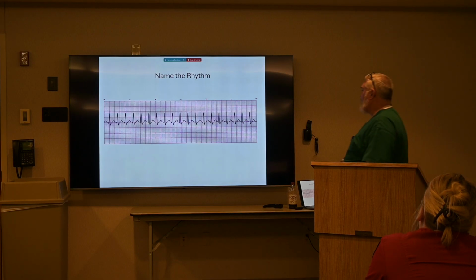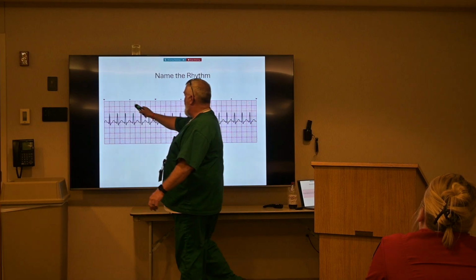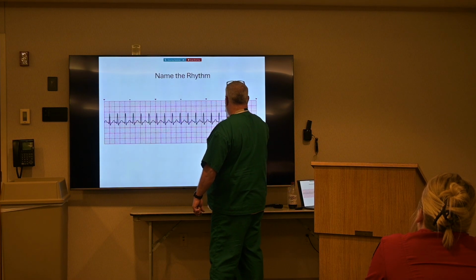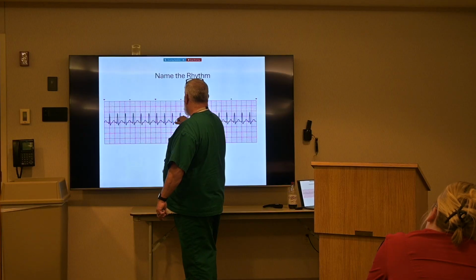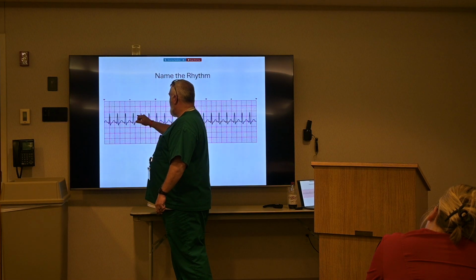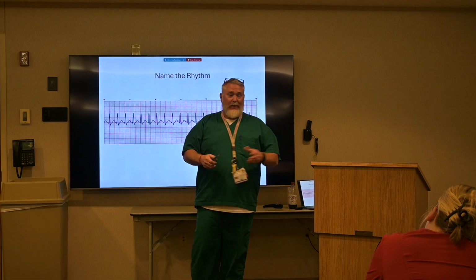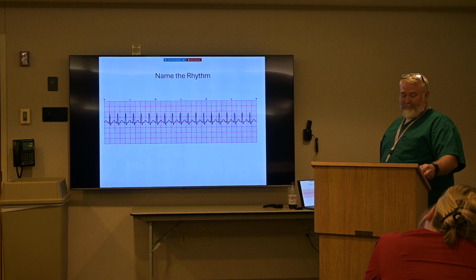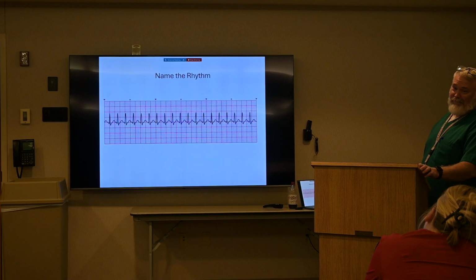So you've got a 6-second strip, 1, 2, 3, 4, 5, 6. If you count the R to R, 1, 2, 3, 4, 5, 6, 7, 8, 9, 10, 15, 16, 17, 18, 19. So the rate's about 190. That's trucking right along. Are there P waves?